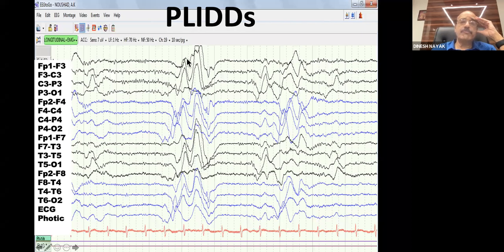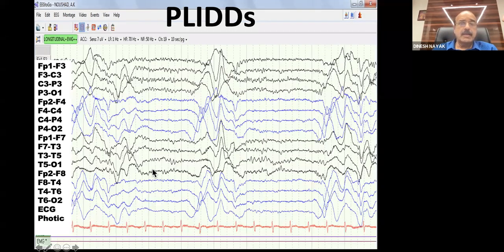You get huge waveforms in the bursts, and you see that they occur every 3, 4 or 5 seconds. Here it's a little shorter, obviously, but usually it's much longer. And then when you compress the page, you see that it is very, very periodic.